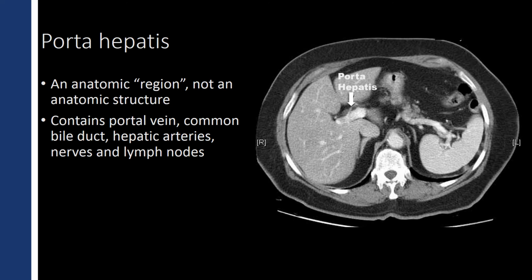So these lymph nodes in the portal venous system are often the first lymph nodes we see that are enlarged with GI cancers or GI problems, cancers or infections or whatever. So this is an area we really look at very closely for enlarged lymph nodes to see if there may be metastatic disease, to see if there may be some sort of a GI infectious process.